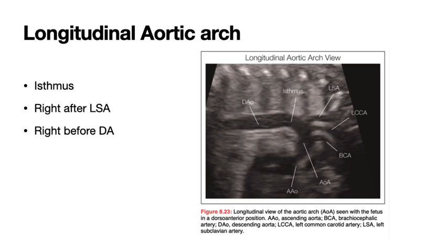Here's another view, same deal. You've got your isthmus, you've got your transverse aortic arch, ascending aorta, and all the head vessels.